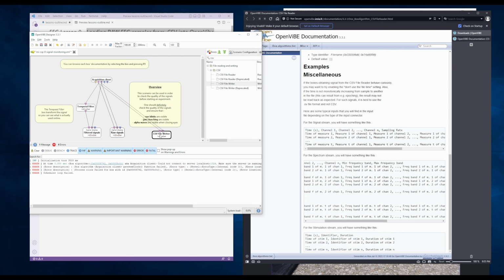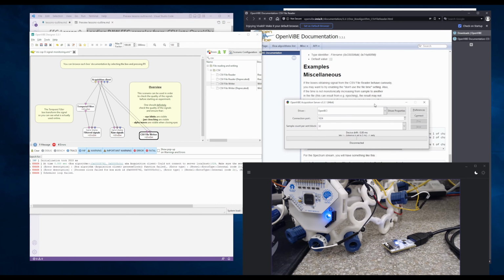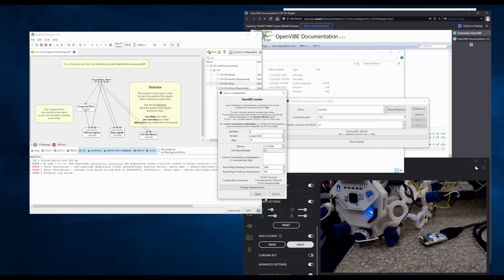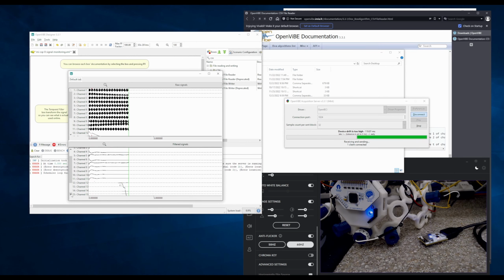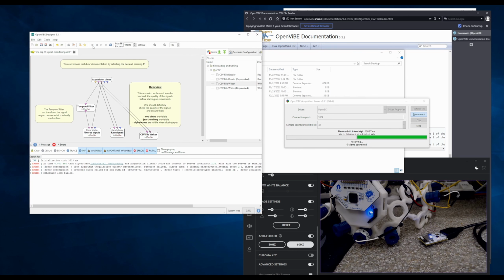All right, and let's run the acquisition server again. Let's see. Lower the exposure. All right. Properties. Yep. Use Daisy module. Apply. Connect. Play. Play. These are the rest of them. It's good enough. Stop. Disconnect.